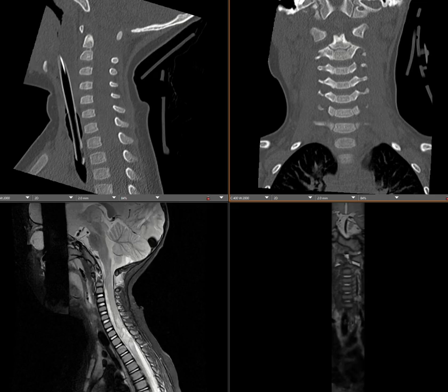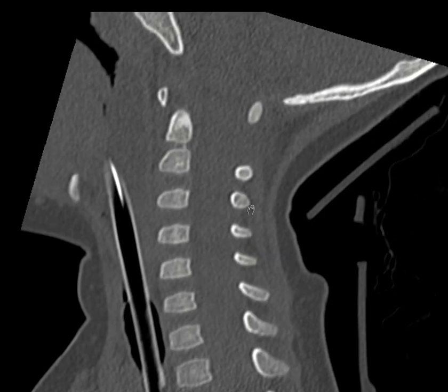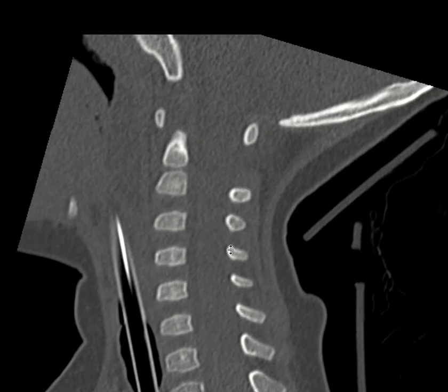So I want to talk about a 3-year-old who comes to the emergency department after a motor vehicle accident. We usually do a cervical spine and head CT for these kids. Sometimes they go straight to the MRI, but we usually get a CT as well in the case that we are just thinking about cervical spine injury. I just want to make this bigger for you guys to pay attention.